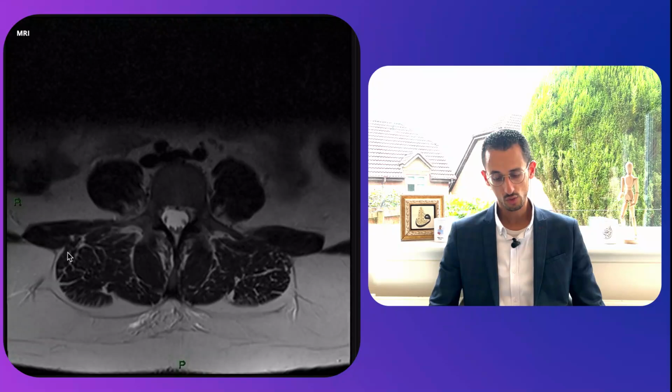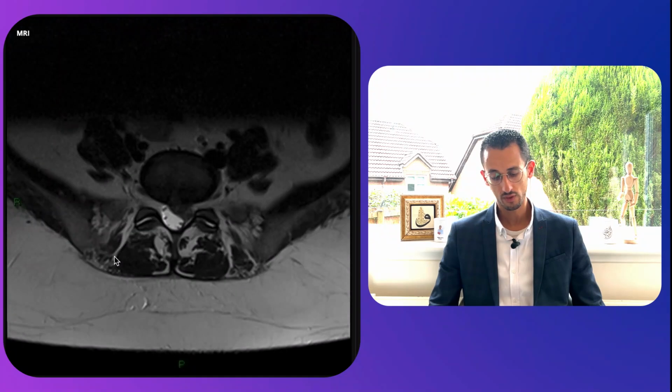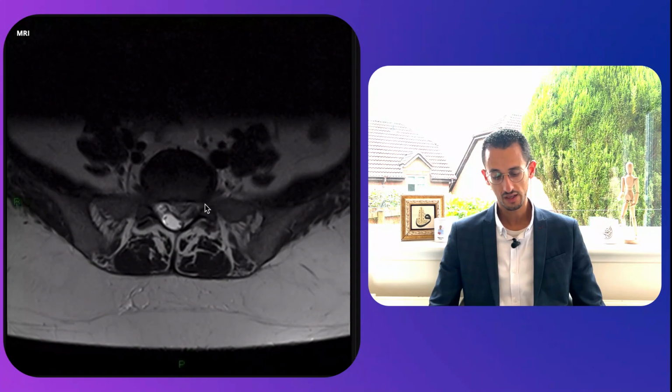What we do here, we look at the T2 axial image, and that's just the top. As we go down, again, that's all normal. CSF, that's the cauda equina nerve roots. And as we go, we would expect something here, very obvious, kind of hypointense, very large disc coming out, more on the left side, pushing the thecal sac.